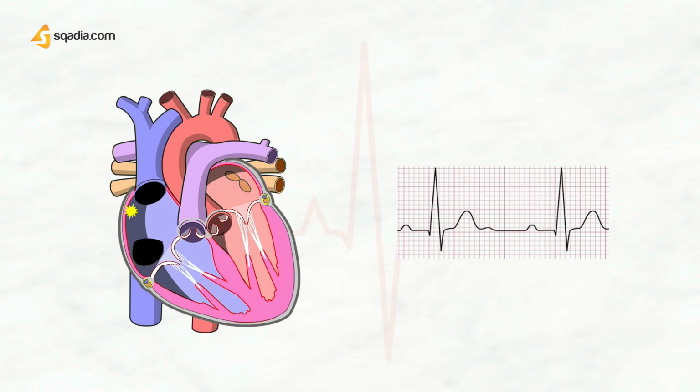Now, as a quick reminder from our ECG basics video, we know how the electrical activity moves through the heart. The SA node, then the AV node, through the His bundle, then the bundle branches and Purkinje fibers. The PR interval here is the whole conduction.